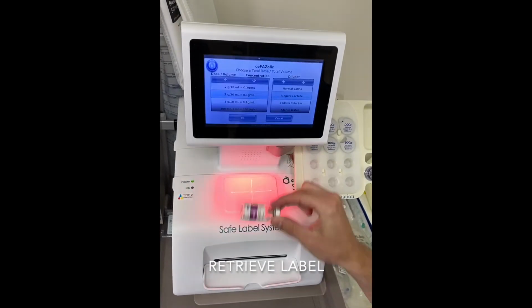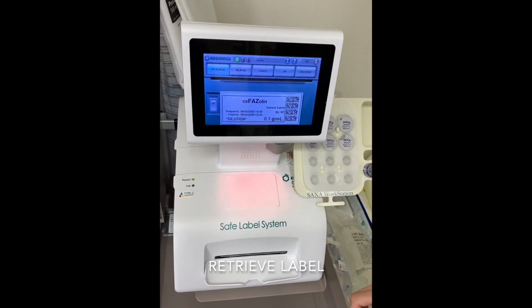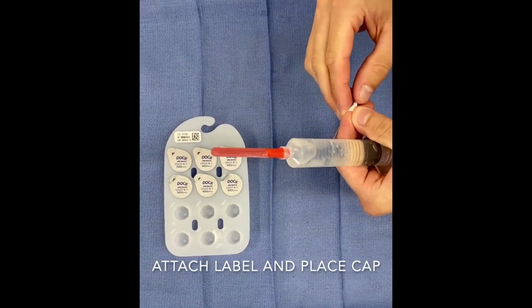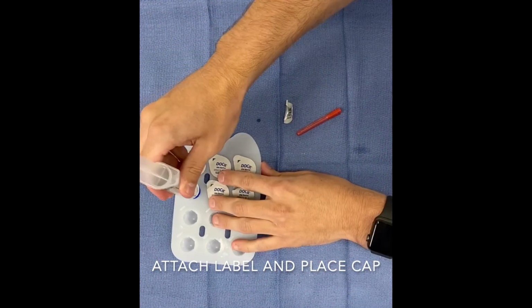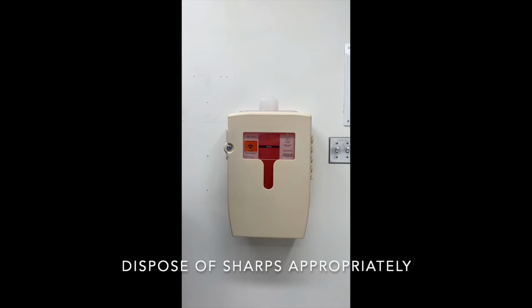All of our anesthesia machines have attached label makers. Simply scan the medication bottle and attach the label to the syringe. Be sure to attach an alcohol cap at the end of the syringe. Dispose of the needle in a sharps container. It is very important to label all medications you draw up to avoid any administration errors.